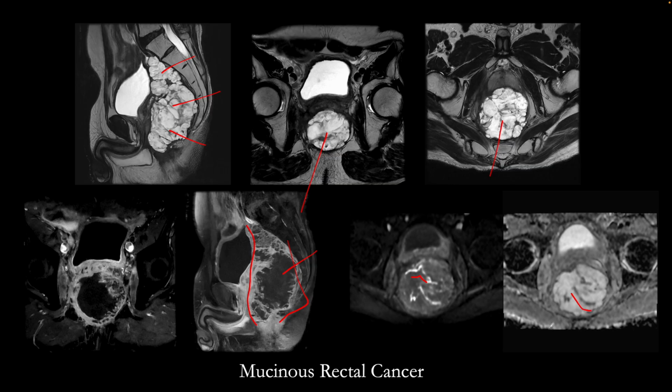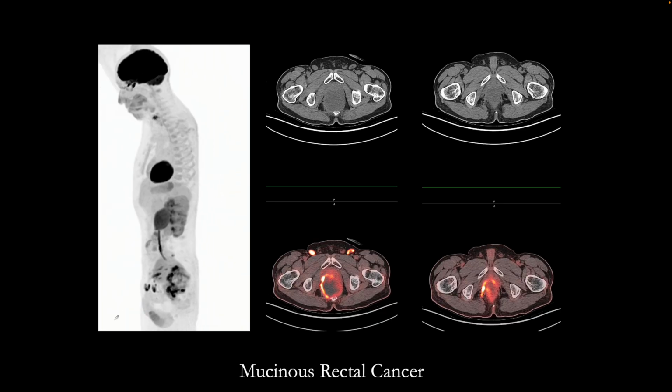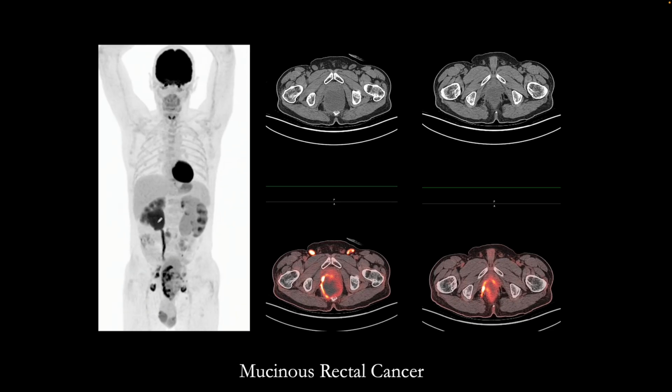This patient also had an FDG PET CT. Very interesting findings here. Let's start with the rotating image. We see hydronephrosis and hydroureter. So the kidney, where I told you that the function was preserved, is excreting some FDG into the urine, seen right there. And on the other side, we see that the function is impaired. And that's the side where we saw that the cortex was thin.